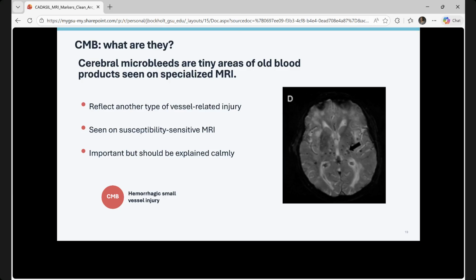And we are very careful on the size only in the context that if several bleeds sort of land on top of each other, it looks as if it's a much larger bleed than other bleeds. And so we actually call that a macro bleed, and we can separately count those. But as I said, given the way that we're imaging this, they're just so nearby that they look like they're the same bleed, but it's just more than one bleed adjacent.